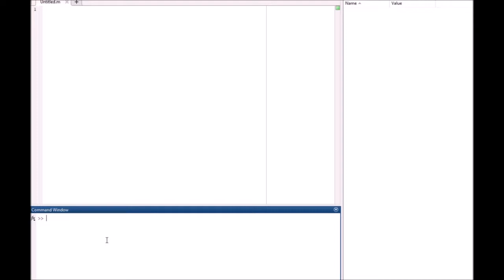And once you pull that data in, go through and get a frequency type thing, so you can get it to come out with the correct values. And then finally, the last part of this, the whole purpose, is to do something fun with it, which in this case is to get a heart rate value.